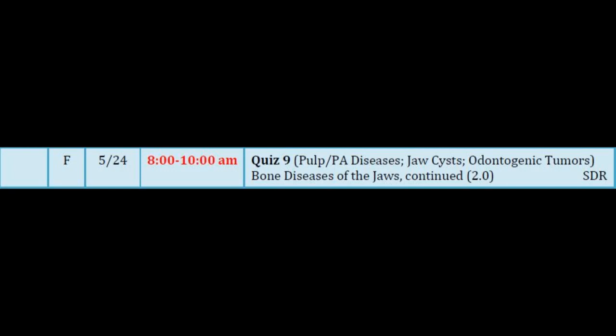But one of the ways you can distinguish this from other multilocular lucencies is the edge of it, and the age of the patient. This does tend to be a little younger than conventional ameloblastoma. Conventional ameloblastoma, multilocular, has some cortication at the edge of the loculations, at the outside border, whereas this is punched out. And so radiographically, you can usually tell it's not one of the others.